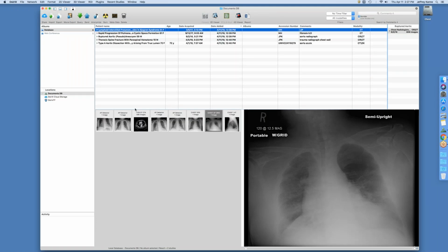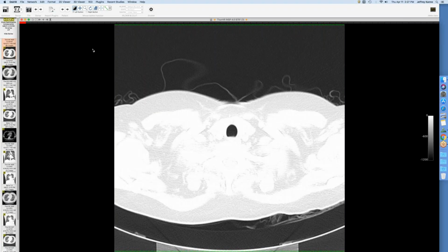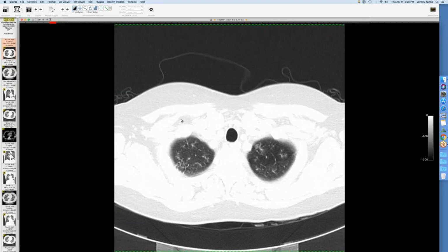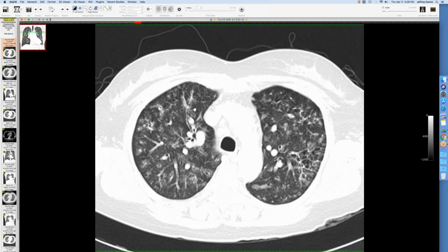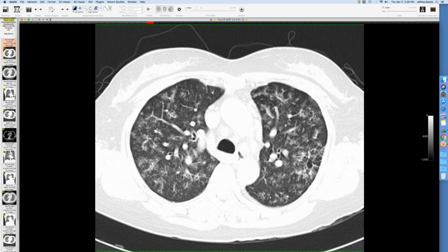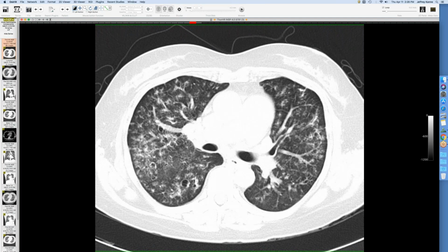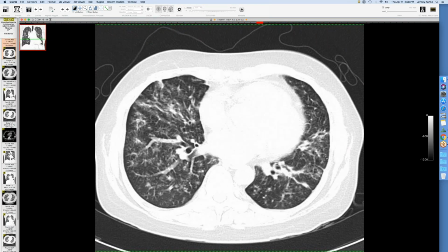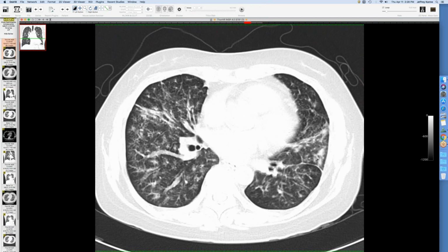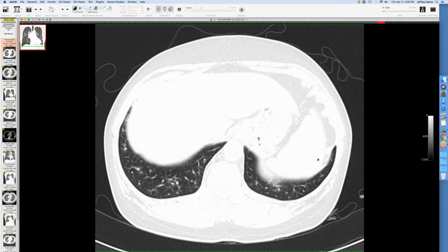Now I have two interesting cases from our observer Mohammed, who's been with us, who's from Malaysia. I've shown a couple cases before. So this is a patient with this very interesting CT. It has sort of these ill-defined nodules around the airways and some of the vessels, a couple little cystic spaces in the lungs as well. And there's a larger area, sort of a larger nodule here, and some almost not quite tree-in-bud, but some branching-looking nodules down in the lower lobes. And this patient carries a diagnosis of Sjogren's syndrome.